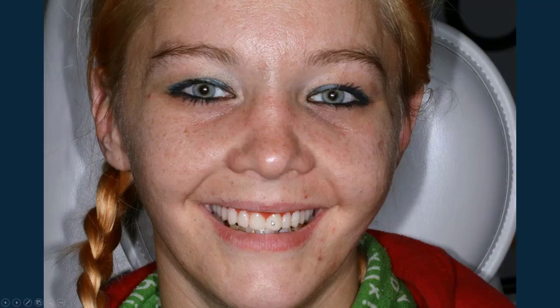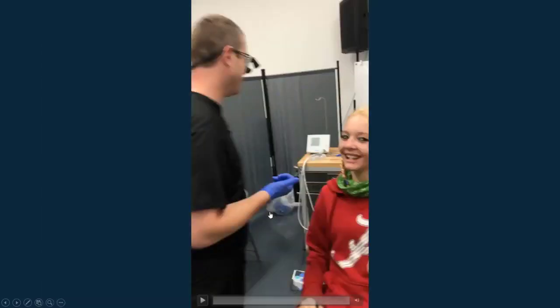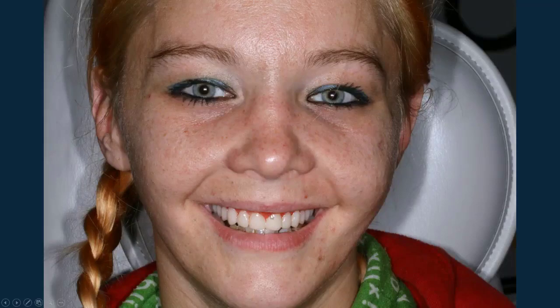Now I'm going off memory. If I remember correctly, I think this is just a monolithic printed denture, I think in Flexera Smile, that we pinked. I could be wrong on that. It might even be a two-piece denture, pink and white, but not really relevant either way. But look at the difference here from where she started, okay? An absolute game changer for her.